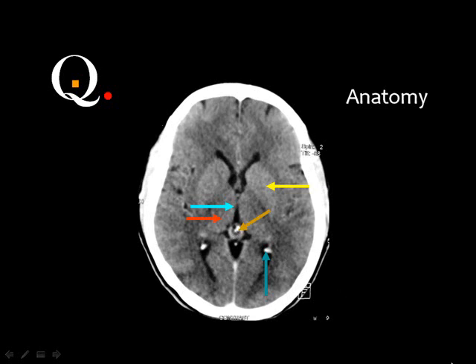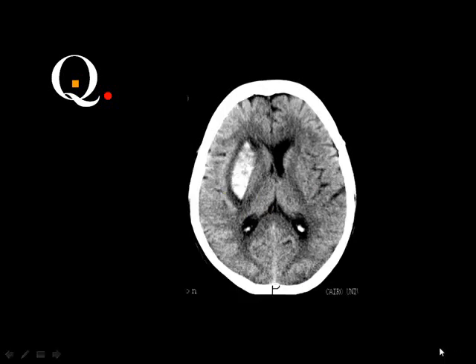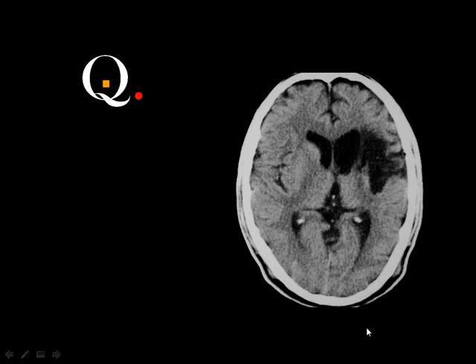What do you think of this? The pineal body. And this? Right caudate nucleus. What do you think of this lesion? Acute intracerebral hematoma on the right side. Then what do you think of this? Yes, area of encephalomalacia or chronic infarction on the left side.